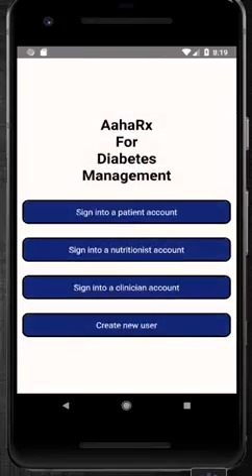We won't be going through the clinician settings because they are largely the exact same as all of the nutritionist screens. And with that, we will conclude the video for the AhaRx Diabetes Management app video.